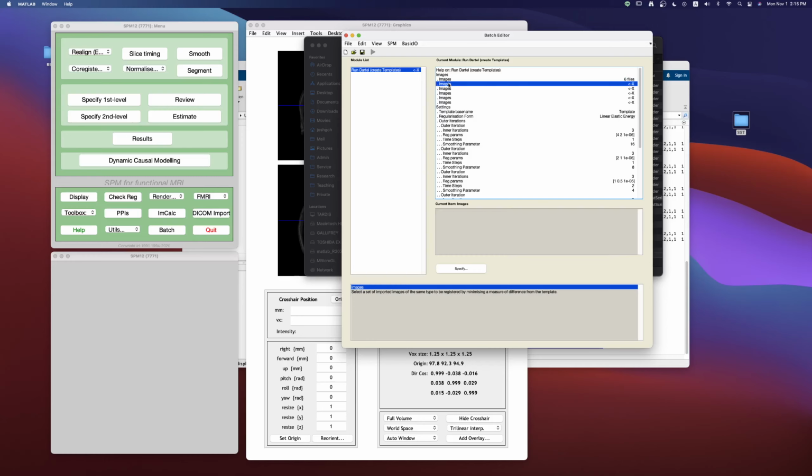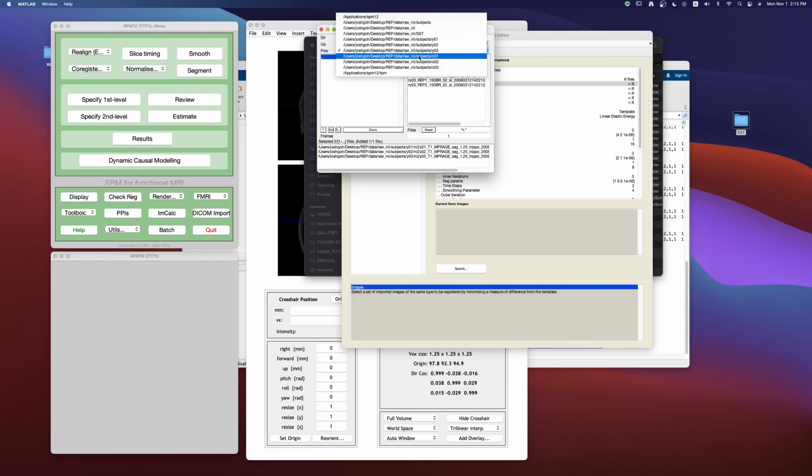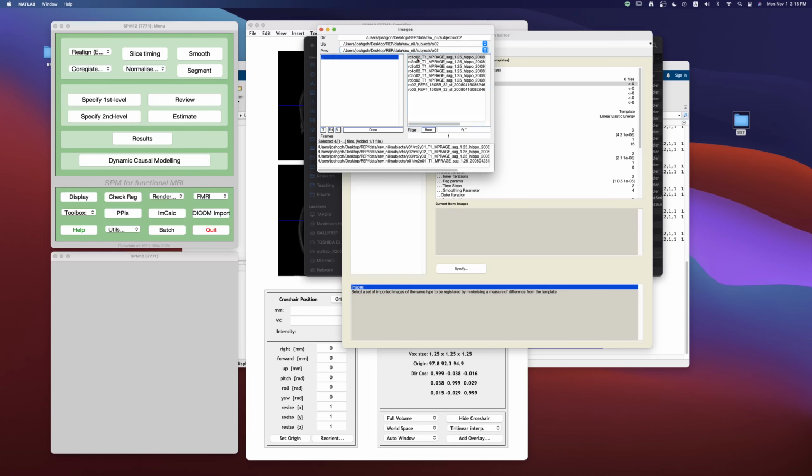Okay, and then obviously for the next one we're going to do RC2. So same thing, going to go to the subject Y01. Now we're going to click RC2. Same thing for all the others. It gets a little tedious at this point, so be careful.